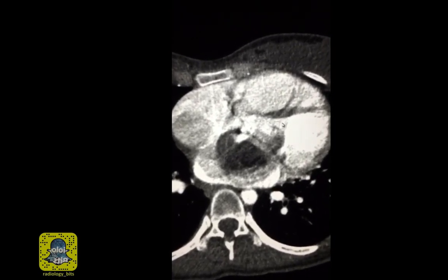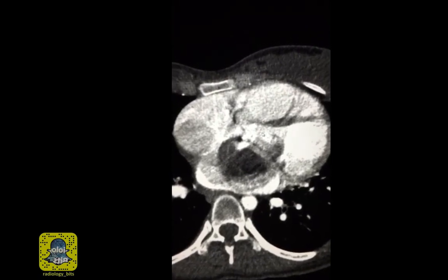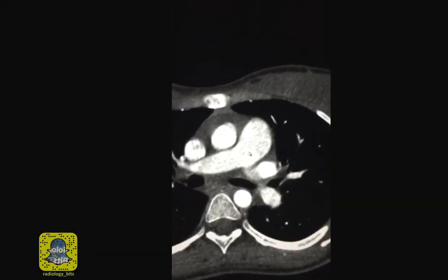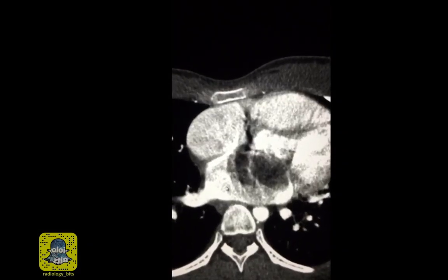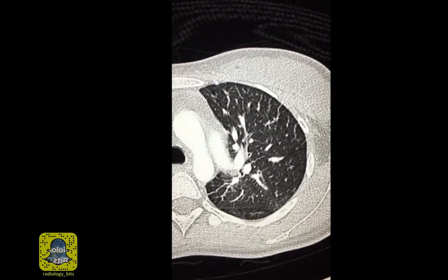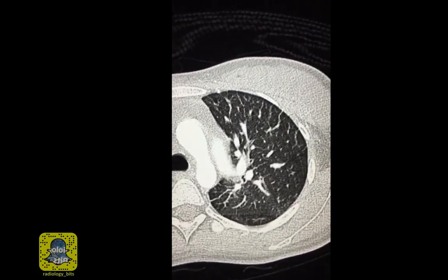And now you understand, as a medical student, we used to talk about the differential diagnosis of pulmonary arterial hypertension, and we used to include myxoma in that. And if it's acting as a stenotic lesion, this would explain why you have dilatation of the left atrium, the right-sided cardiac chambers, and the pulmonary artery as well. If the myxoma is large enough to impede the venous flow or to occlude the mitral valve, it could give you congestion. And that explains the septal thickening, the thickening of the small airways, and the heterogeneous appearance of the lungs.